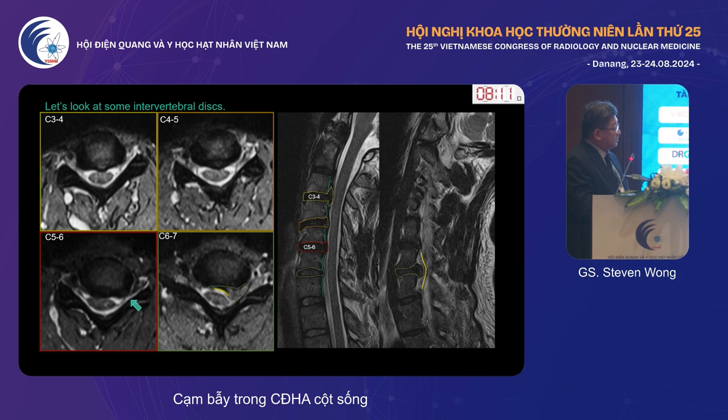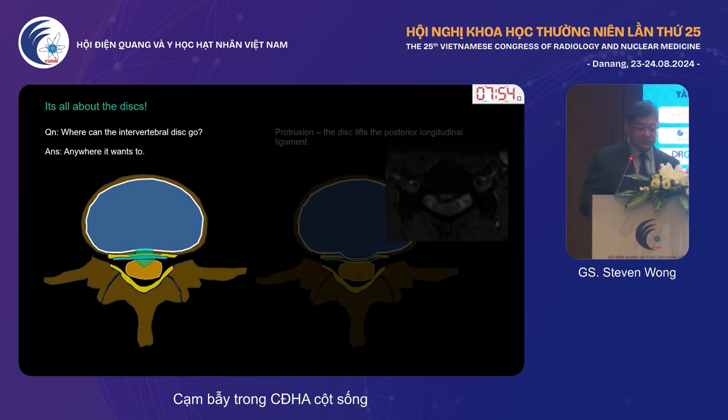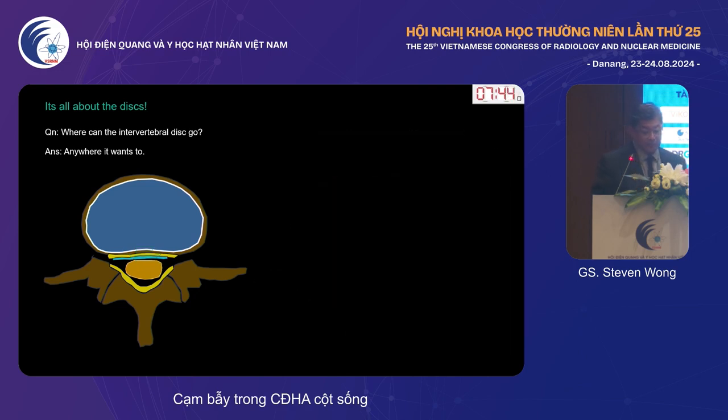All right, so in here, sometimes you have narrowing of the neuroexit canal by osteophytes and other entities as well. All right, so the disc will go wherever it wants to go. Most times it just goes anterior, posterior, beneath the posterior longitudinal ligament. I will call it a subligamentous disc protrusion. Nothing to worry about, okay? Just report it, surgeon's quite happy.